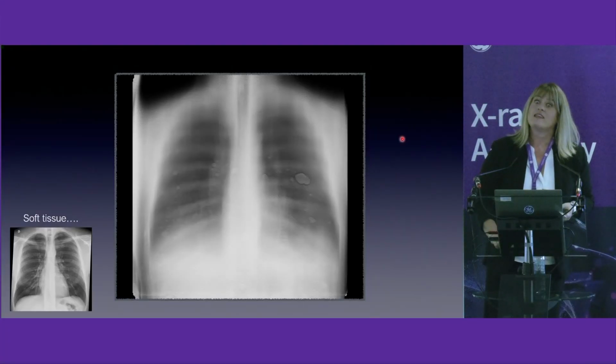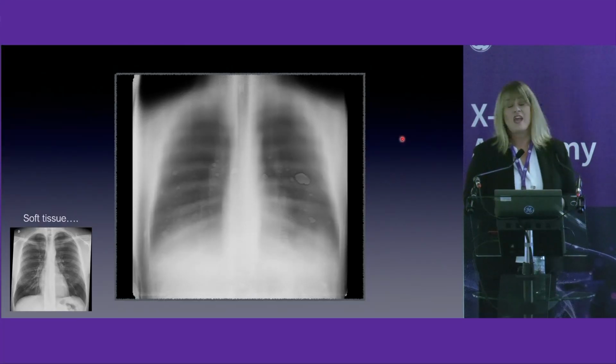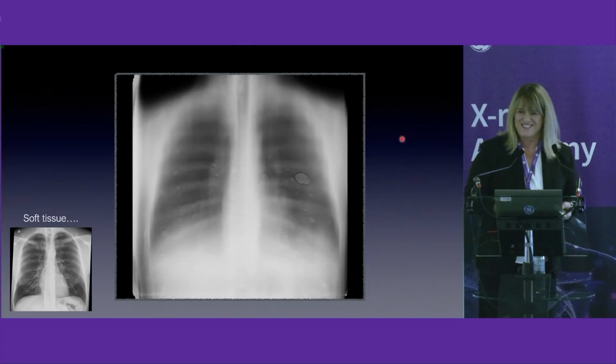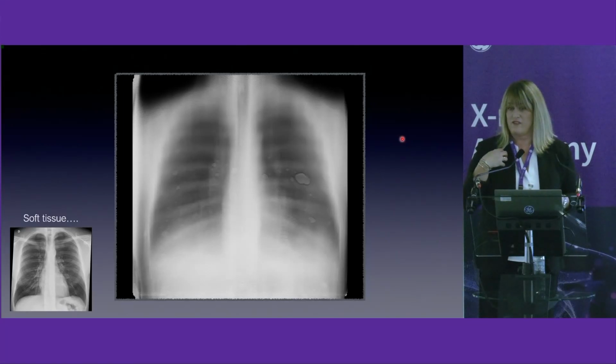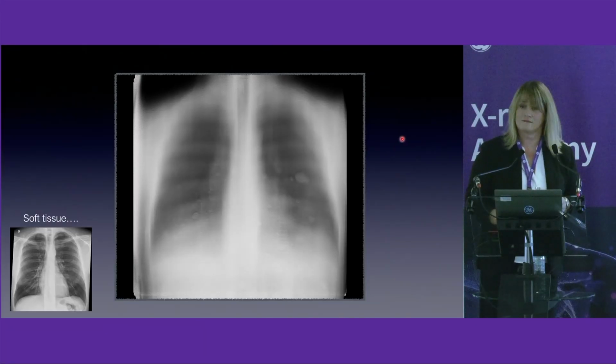Yes, if you see the patient, that's the point. If you see the patient, you can assume that those are skin lesions. In this particular case, one of my favorite techs told me, Elisa, there's something wrong with this patient, come and see him. So I can see all of the nevi. That's what I say to the radiographer: show me, draw me what he has on his skin.